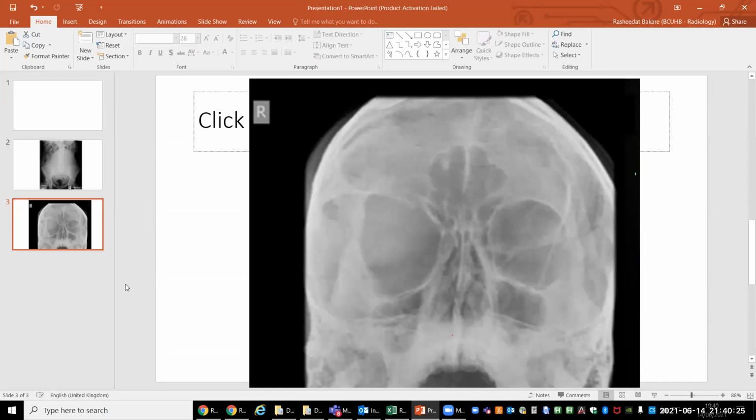In that case, I would like to check the patient himself for the abnormality, and also I don't see any neurofibromas in the soft tissue provided in the image, so I cannot see any neurofibromas in the scalp. This would be another thing that I would like to check with the patient himself.